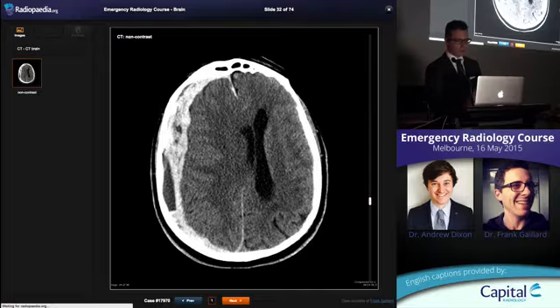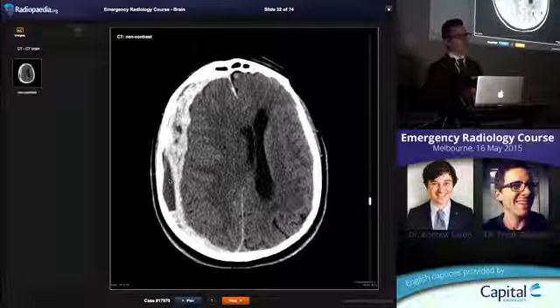In contrast, subdural hematomas have this shape that we saw before. And if you see this kind of appearance, you might be wanting to call this acute on chronic, and you see this often the case. And the reality is that this is a very acute hematoma.